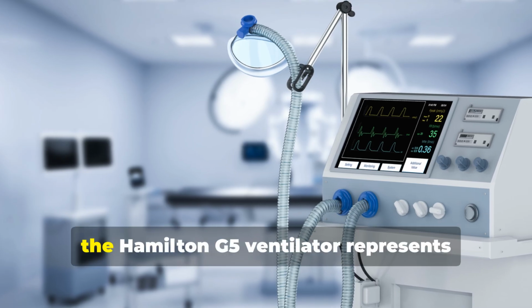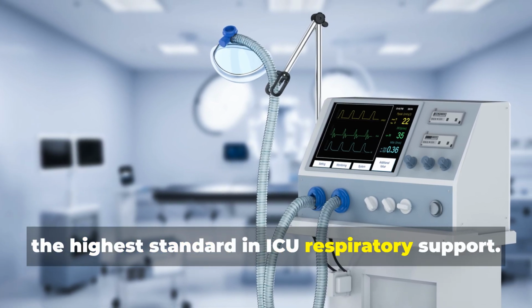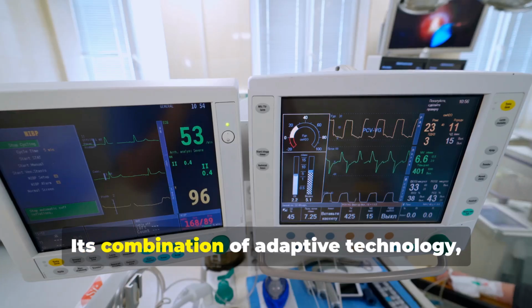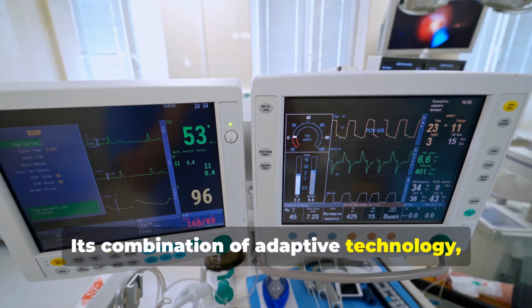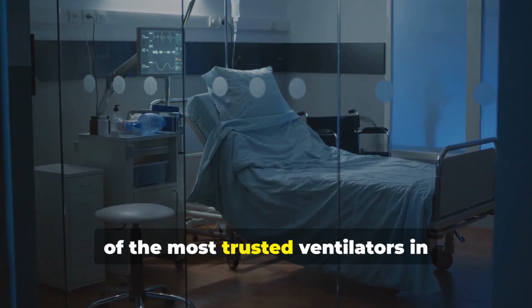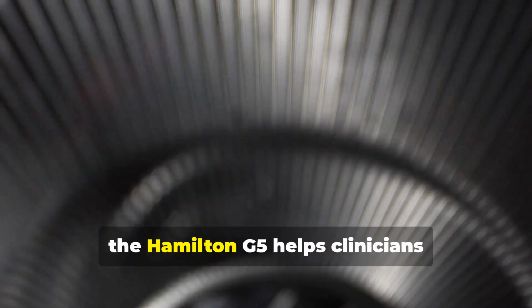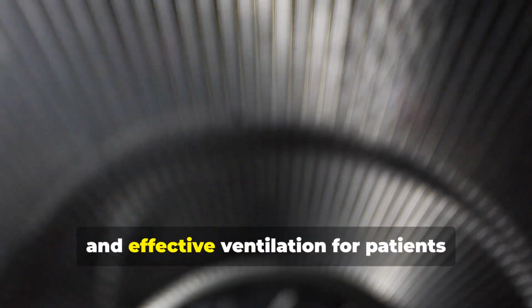In summary, the Hamilton G5 ventilator represents the highest standard in ICU respiratory support. Its combination of adaptive technology, safety features, and clinical intelligence makes it one of the most trusted ventilators in hospitals worldwide. From neonatal units to adult intensive care, the Hamilton G5 helps clinicians deliver personalized, safe, and effective ventilation for patients when every breath counts.